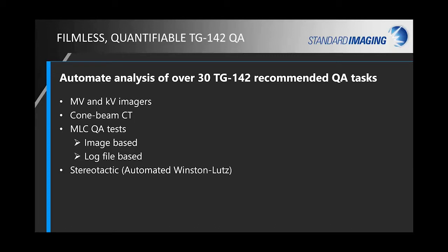We have an automated Winston-Lutz stereotactic test for machine QA, an automated radiation light field coincidence test, and star shot analysis. And we also have an IGRT component, which I'll touch on as well.